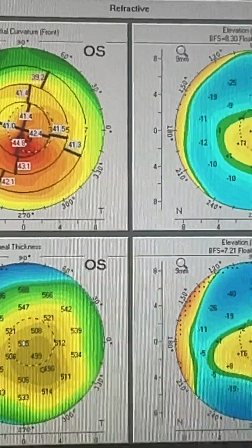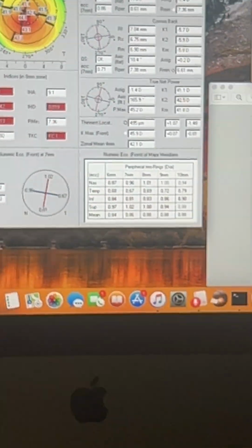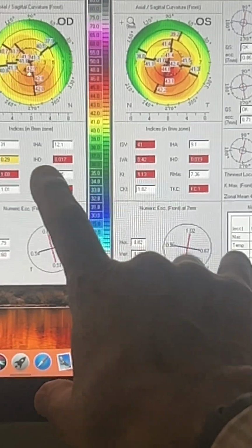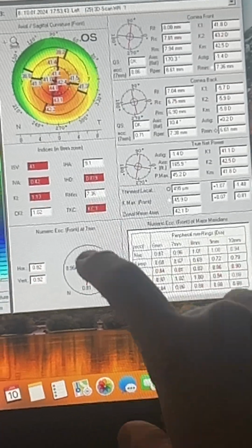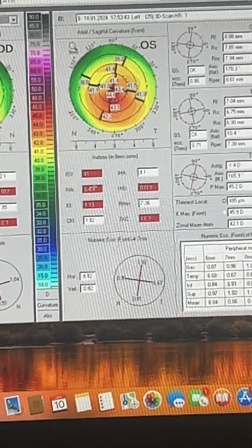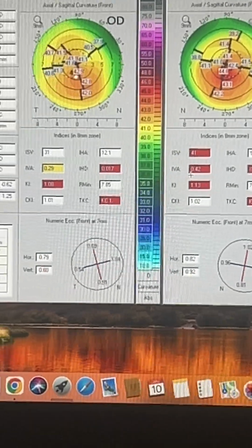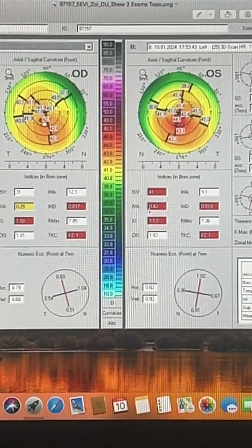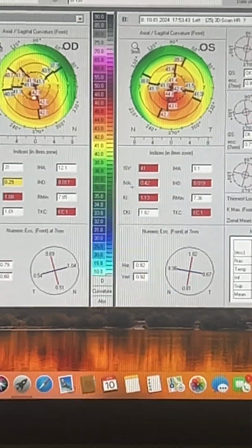And if we look at the Pentacam assessment, sure enough, it flags the right eye as keratoconus stage 1 with an IHD of just 0.017, and with an IHD of 0.019 on the left eye, also keratoconus stage 1, although the ISV is far worse on the left eye, and the IVA. Facts that we've talked about, we've published, and shows that although the Amsler-Krumeich criteria on the Pentacam are helpful, they're not doing justice here of the difference that's seen between the two eyes.